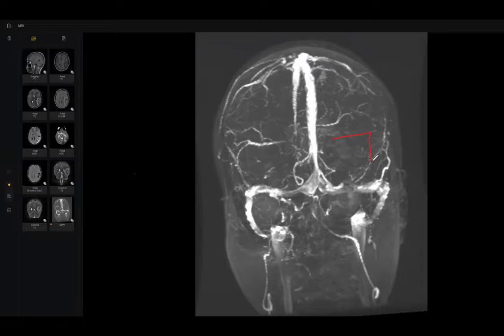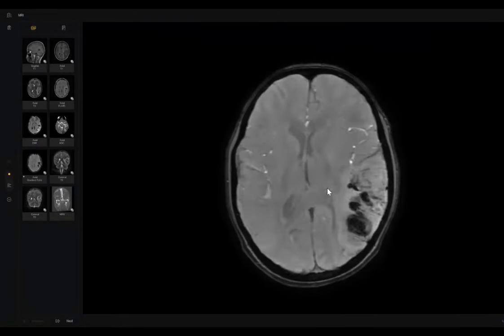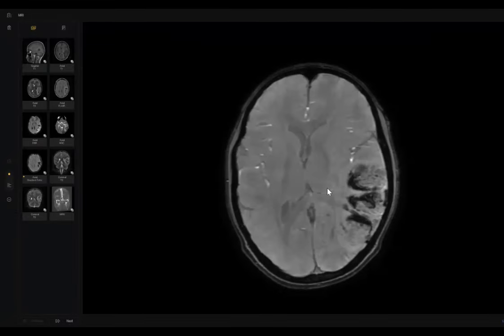So it may be a cortical branch venous thrombosis or superficial venous thrombosis. Correct? Why? Because there is asymmetry here, a paucity of veins that show in here. And we are dealing with hemorrhagic edema here, edema plus hemorrhage.